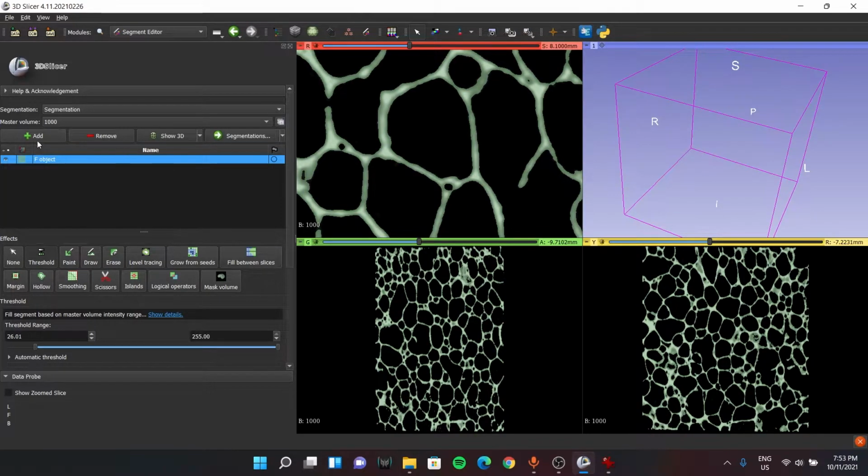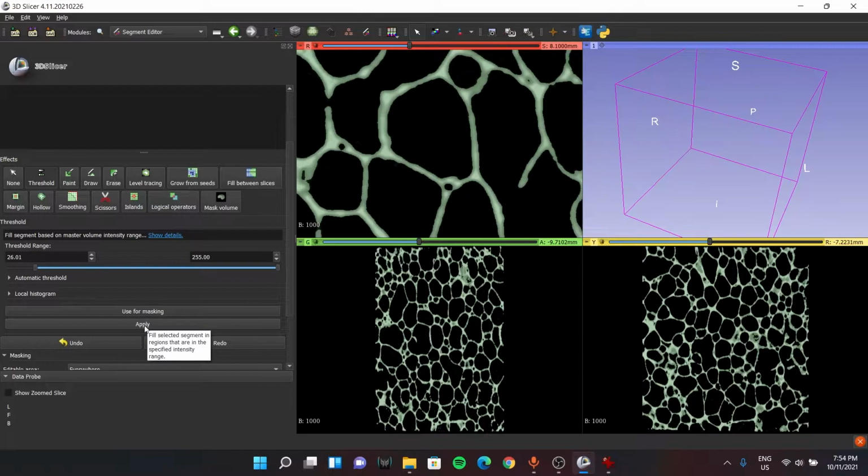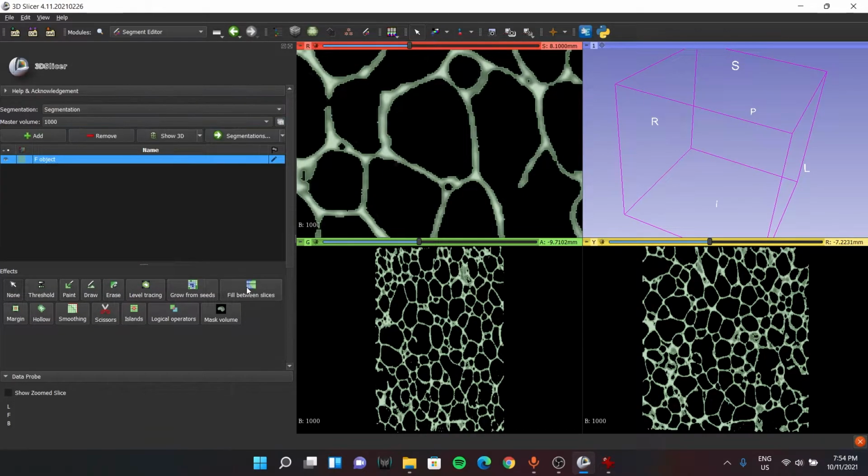So now what we'll do is, here scroll down a bit, here this is apply. Now you hit apply. That's it. Now comes the main part where we create a 3D object from this. Depending on your hardware, it might take you from about 15 to 20 minutes to somewhere about 2 to 3 hours.